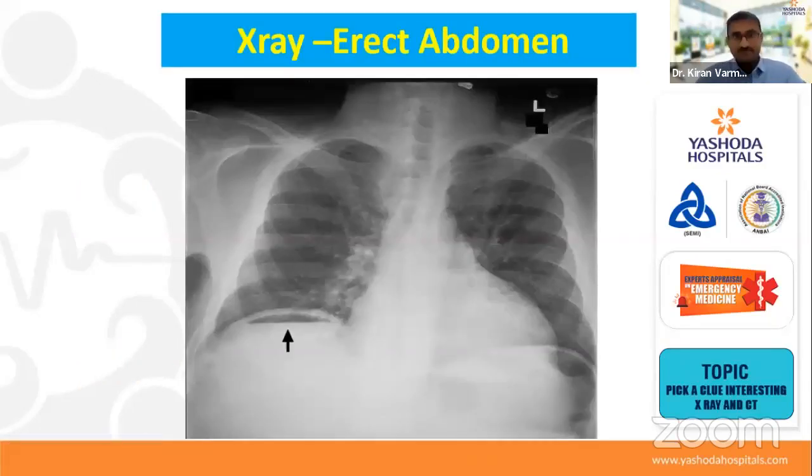So this is the X-ray. So what do you suggest? So what are your findings here in the X-ray? SAO less likely. Yes. Adil. Air under diaphragm. Yes. Any other? Yes. Pneumoperitoneum. Good. Preeti. Sandeep. Ground glass. Okay. Good. So I think majority people on the track. So we're so happy for it. So it is nothing but perforation.